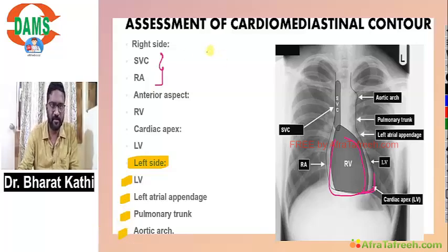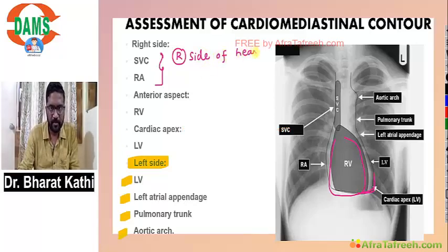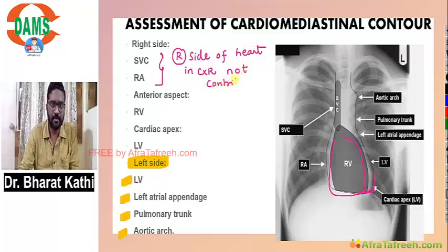So very, very important: the right border of the heart in a chest X-ray is generally not contributed by the right ventricle.